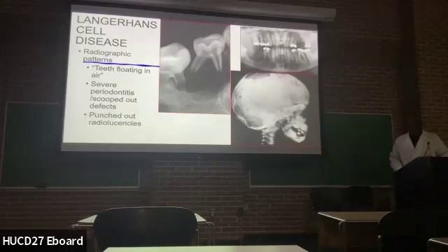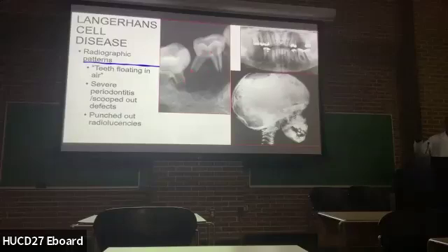Yes. Looking at this, it looks like large radiolucencies to me. Okay. And this scooped out pattern is representative of severe periodontal disease. You can kind of see the floating in air. This is, at least classically, even when I was a student way back in the day, the first thing, the only thing they gave us. But quite interestingly, this is very, very similar to multiple myeloma.